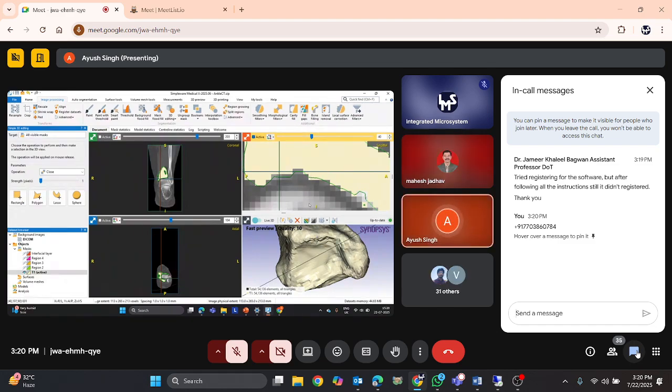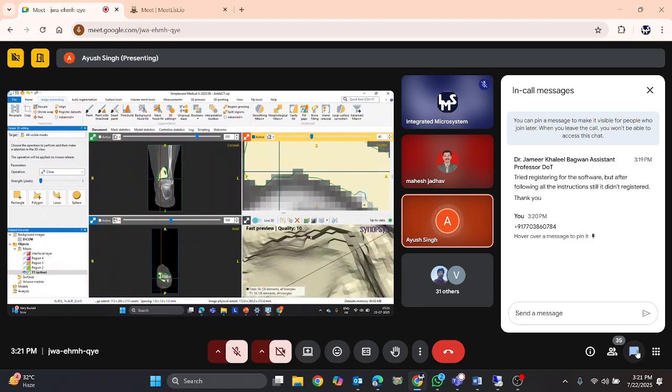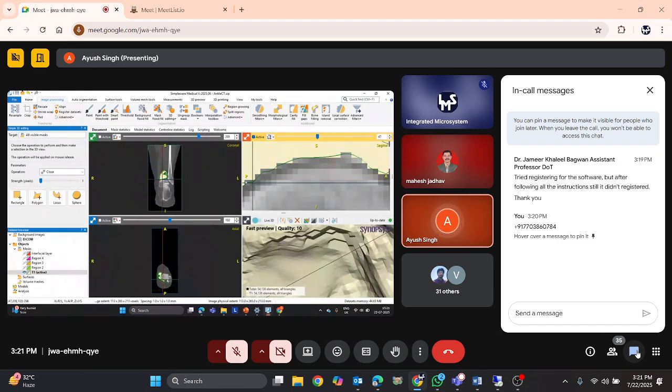So coming back to this particular close operation, open operation. Since I was discussing, if I need to apply the operation over here, first I will go to the specific point. Now, if I am bringing the pixel strength around 3 pixels for the specific region, we will be seeing the contour level change slightly when we have done this.